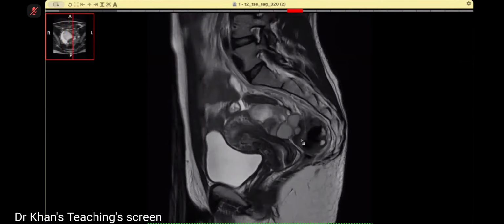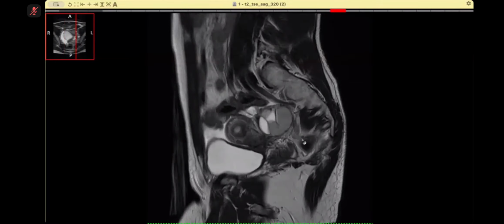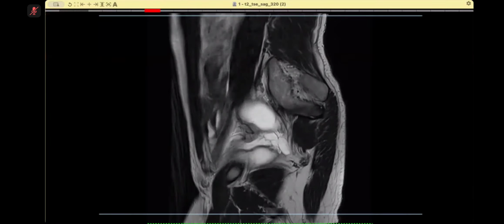Enhancement can be normal enhancement. Enhancement does not mean that there is infection. There will be cases, rarely, where there can be secondary infection, and we have got a DWI also. So contrast is only in the world of what we call PID. Otherwise, it's not an important sequence. So this is the DWI, and you can see that there is no abscess or anything.